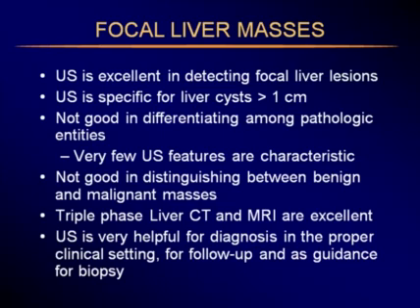Now the last segment that I'd like to talk about in the liver is regarding liver masses.